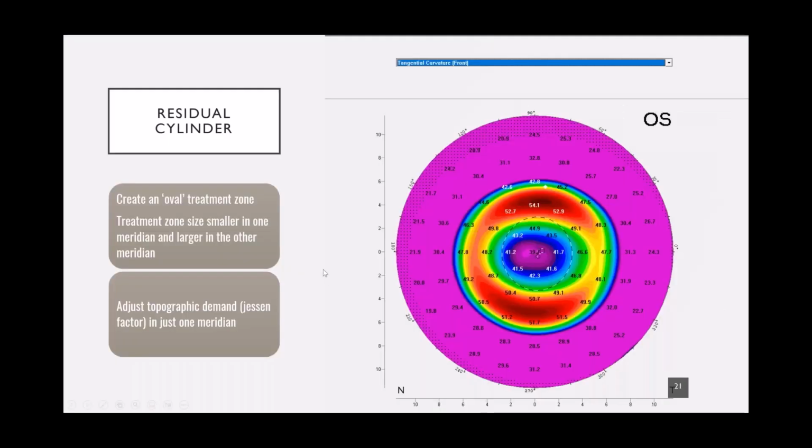Okay, so I've walked through some of the more basic modification tools that are available, but what I want to show you now is something that is maybe just a little bit higher level. It gets to be a little bit trickier because some of the modifications you can do within WAVE are really beyond what the modification tool bar that I already showed you can do.